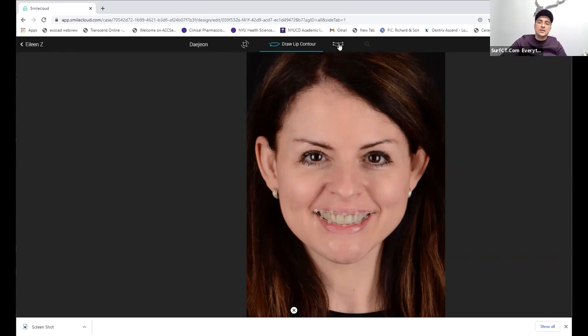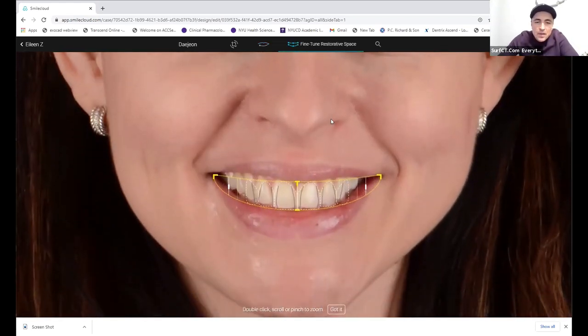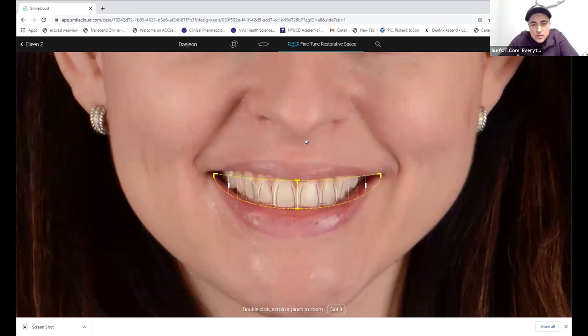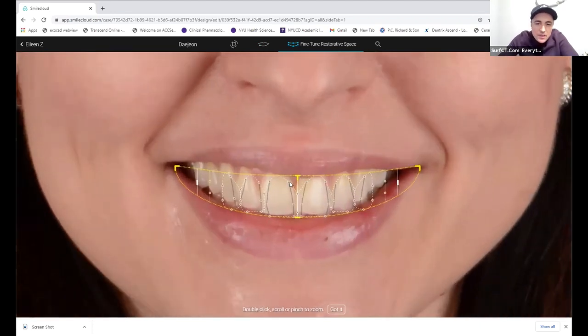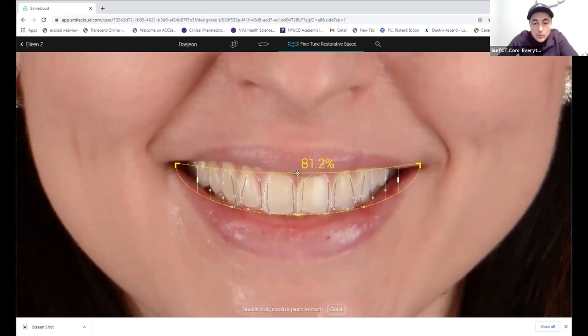to the next slide, which you just click on, and it will show you a little bit of a suggestion. This suggestion has something to do with the zenith that you can move. So you can move these lines, recorrect them. If I click on these dots, it will just change the lines. We'll pull it into the midline, pull these more down.